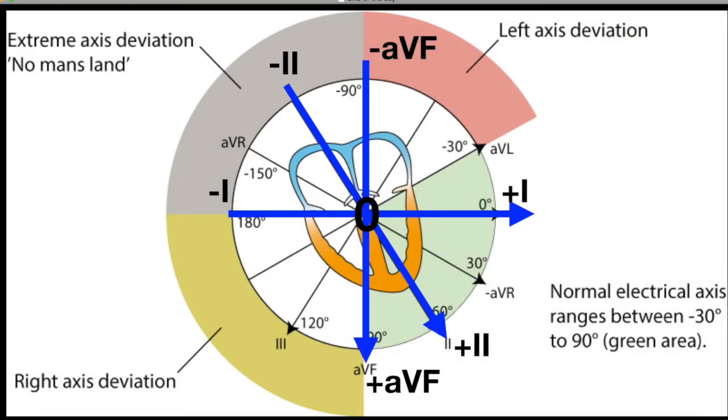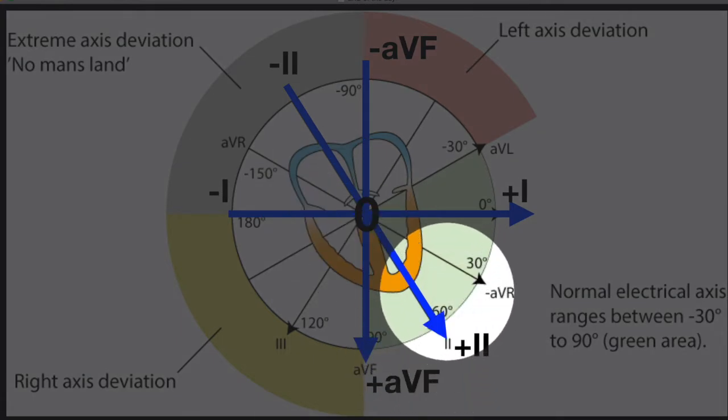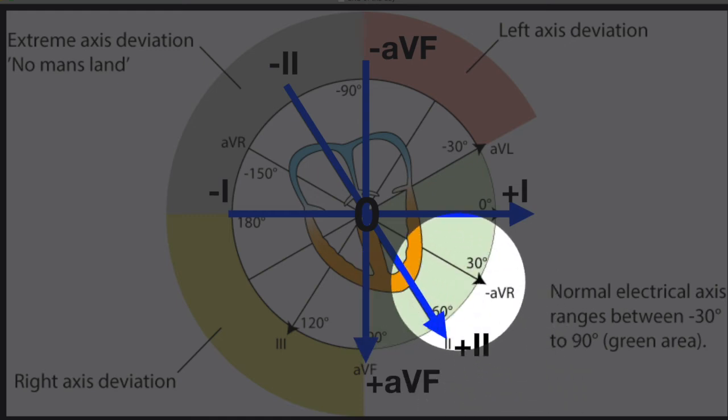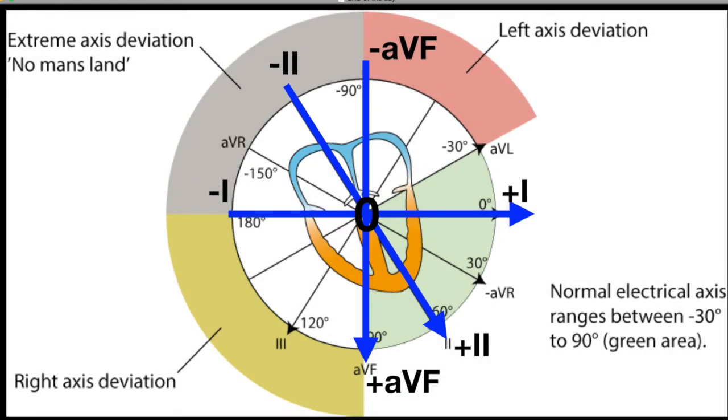And again, you just don't usually see that in a beating human heart. That's just not something that usually happens, because it means that the primary direction of electrical force is going that way, going from the patient's bottom left up to the patient's upper right, kind of the opposite way that you usually expect electrical current to flow through the heart.